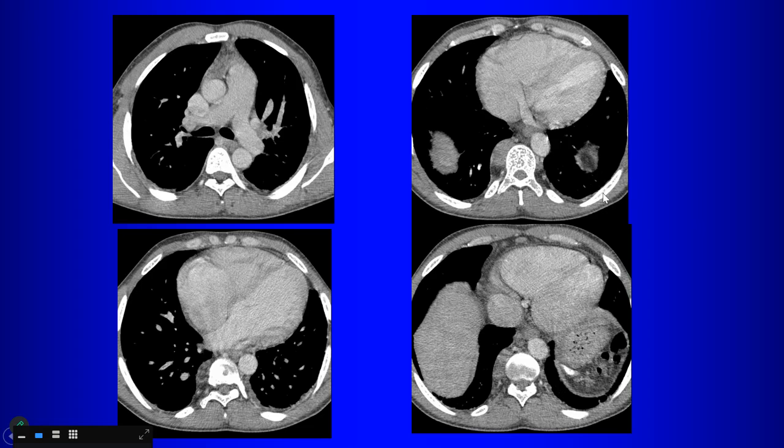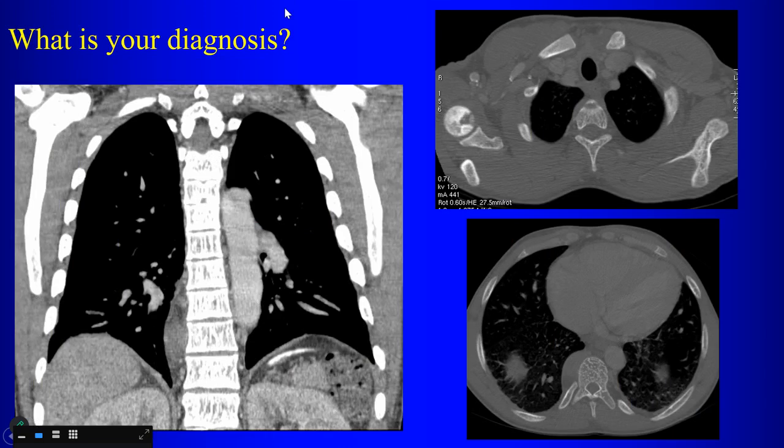Also the bony abnormalities, right? So anytime that you have a paraspinal mass associated with some kind of bone marrow abnormality, abnormalities in the bones, think about extramedullary hematopoiesis. And so that's the case here. It's a patient with sickle cell with extramedullary hematopoiesis, right? And then more findings of sickle cell here. We talked about the autoinfarcted spleen.